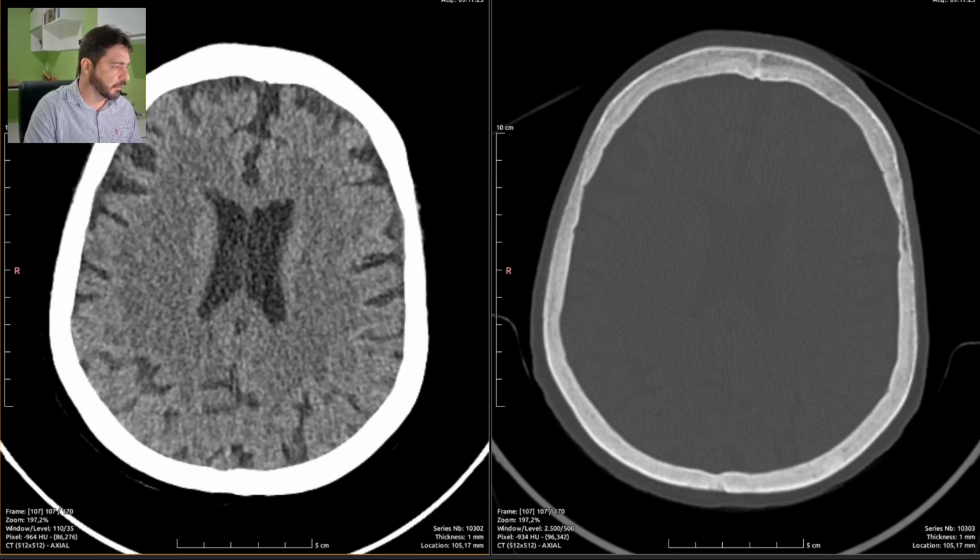And it's only going to get worse in exam quality. Exam quality wise, it's going to be worse and worse. So there is no contrast enhancement, and we have finished.